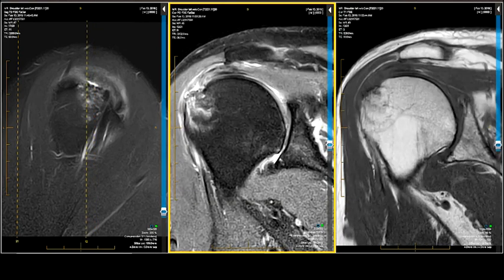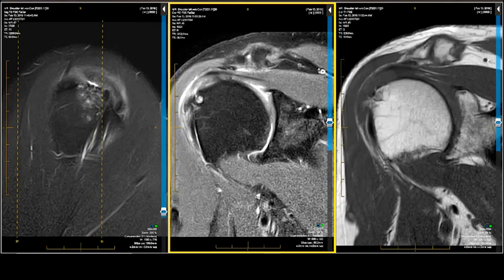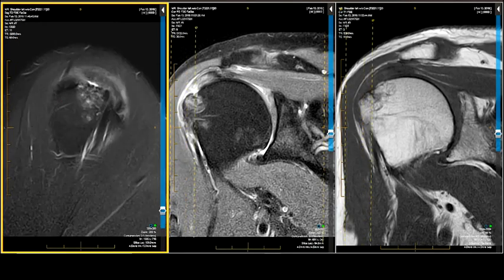Look how swollen it is. See if I can flatten it out a little bit to show to you. So the rotator cuff is abnormal. The reason we didn't perceive it in the axial is it wasn't really a full thickness tear. But it's at the footprint, and it's penetrating into the bone. We call that a rim rent. So we'd say it's a partial thickness footprint tear, distally positioned, with a rim rent component associated with reactive marrow edema. Period.